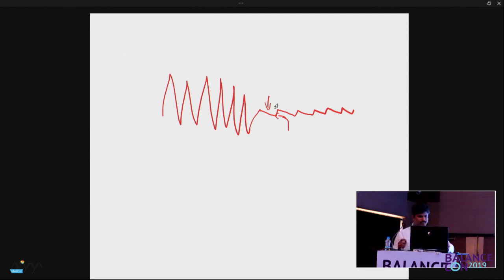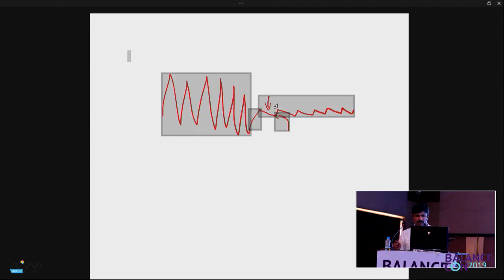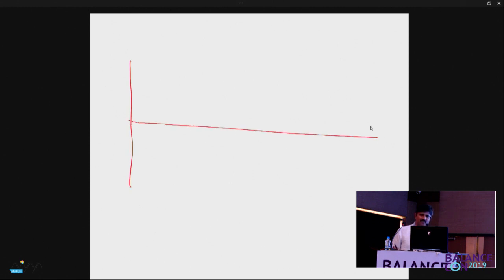So I will draw that. When you see the direction fixed nystagmus, I am just drawing the red line. This line is not seen there, but for reference I will write. So if the eye was in this particular position versus the eye is in this particular position. Fine?